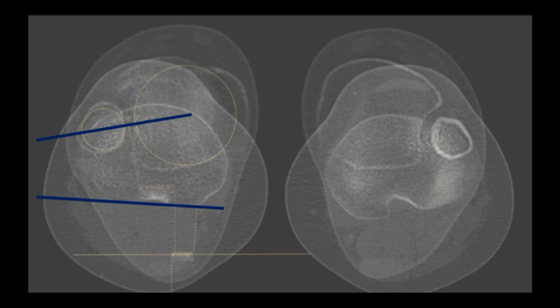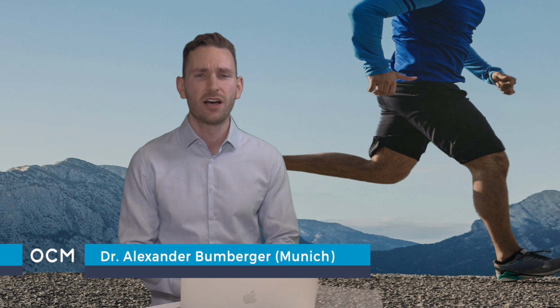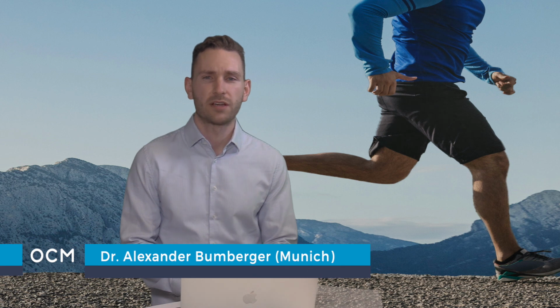So in this case, the femoral anteversion clearly exceeds the physiological range, which is reported to be around 15 to 20 degrees. For tibial external rotation, the physiological range is between 20 and 30 degrees. However, there's a high range of variation of up to 40 degrees. Also keep in mind that the terms femoral anteversion and femoral internal rotation are used synonymously depending on whether deformities at the hip or at the knee joint are discussed.